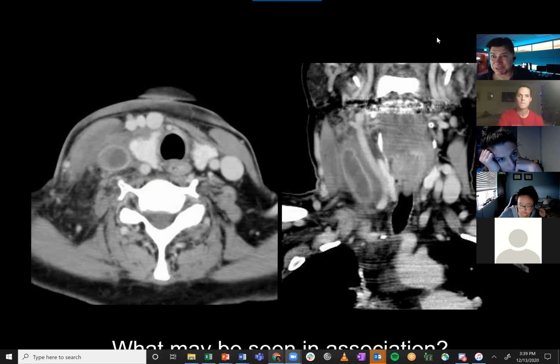So, did he have a CVL? Why does he have this? Every now and then there are rare cases where you can get tumor that's actually in the vein and extending along it. Good. Next case.